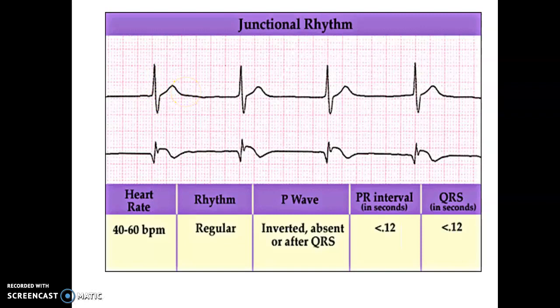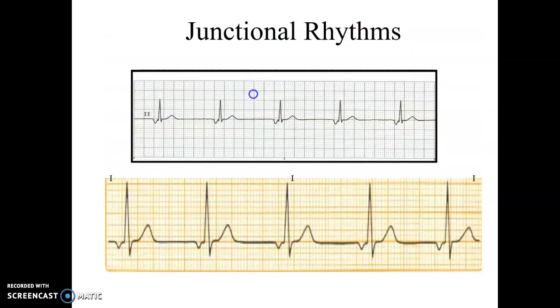And sometimes when you're not sure what you're looking at, we can figure out what it isn't. I know this is not a sinus bradycardia. I don't have a sinus P wave in front of it. I know this can't be atrial fib. In atrial fib, I would have an irregular R to R with no clear distinct P waves. I don't have a clear distinct P wave, but I've got a regular R to R here. And we haven't learned our ventricular section, which we'll be learning next week, but in the ventricular section, we're going to learn that our QRS would generally be wide and bizarre looking. So this is going to make this a junctional rhythm, so I would chart it JR at 40.